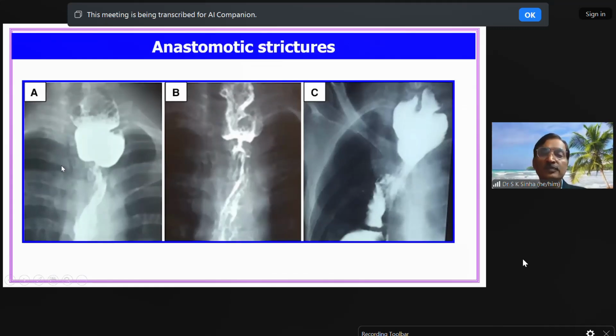A little bit of conventional radiology. So this is barium. As I told you earlier, we are using barium studies less and less now, but we still use them for leaks and strictures. These are the situations where we still use them, and here we have anastomotic strictures, and then we have a neoesophagus, which can be either colon or stomach.